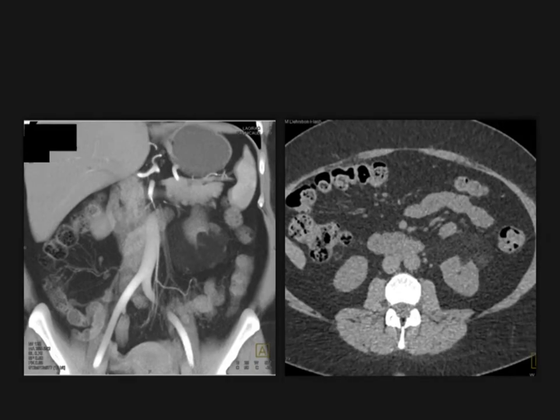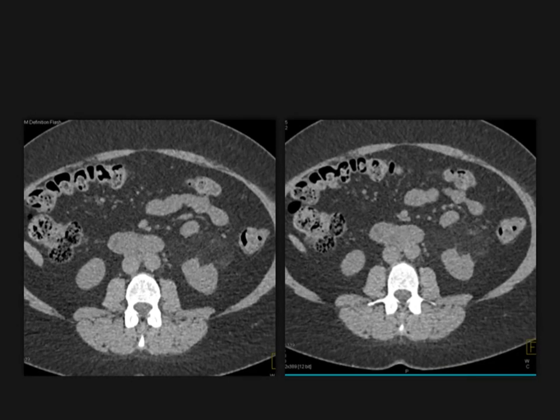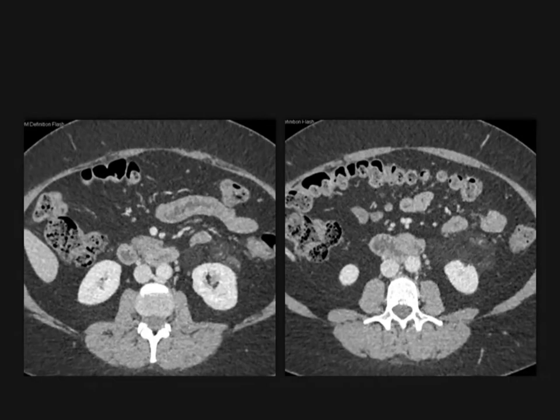Again, you could say liposarcoma. Well, not really in this case. But you can say, how do I know it's not just fat adjacent to the kidney? Maybe it's fat abutting rather than involving the kidney. But when you look at the 3D images, you look at all of the images, the coronals, the sagittals, the reconstructions, it becomes clear that there's a fatty mass hanging off the kidney.